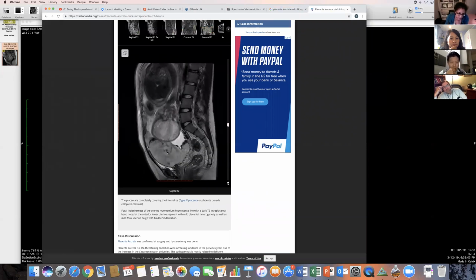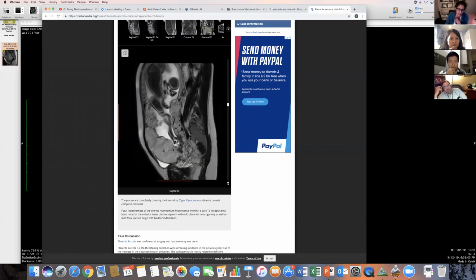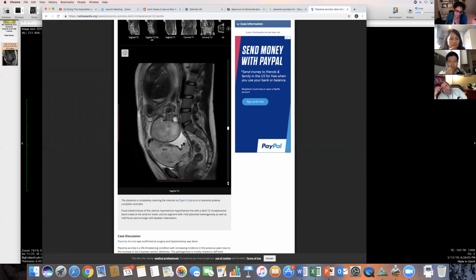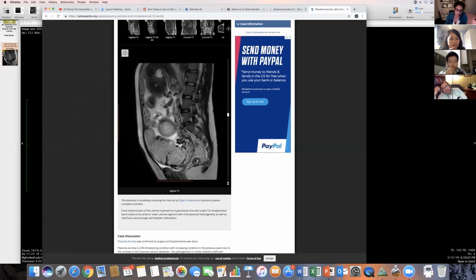So they are basically bands of fibrosis. These placentas often have really abnormal vascularity within them and get areas of ischemia and fibrosis, and that's what causes these bands. So these bands are not flow voids, although these placentas can also have a lot of abnormal vessels. But for MRI, we don't give contrast in pregnancy, so we didn't see the abnormal vascularity that much.